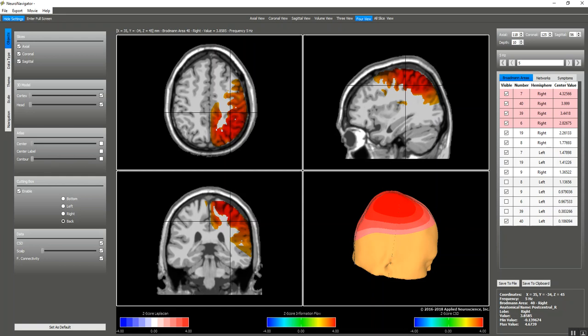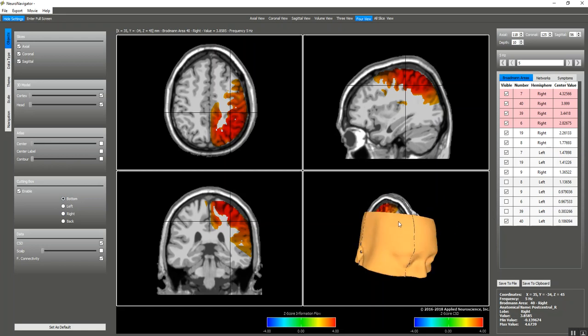So this is a quick update. It's available in the demo, and of course it's available inside of NeuroGuide. And it's fun to play around, explore the brain, find out which regions are deviant from normal and how they link to the patient's symptoms. That's the goal, is to evaluate parts of the brain that are not working right, and then target those parts of the brain for neurofeedback or for other remediation methods to identify and to help that individual with their symptoms, to reduce their symptoms.